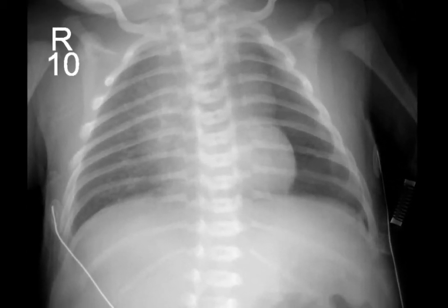There's another example of a unilateral hyperlucent lung. The whole left lung looks more lucent compared to the opposite side, and look how much sharper the heart and thymic borders are compared to the right side. So sometimes you won't see a medial lucency or a subpulmonic lucency, or certainly the visceral pleura laterally. Sometimes it's just a unilateral hyperlucent hemithorax. And again, if you want to confirm it, you have to do the opposite decubitus view.